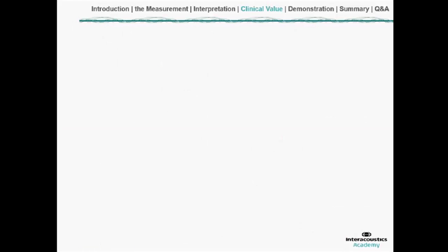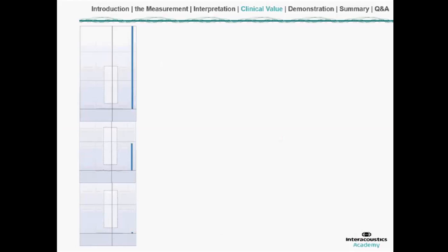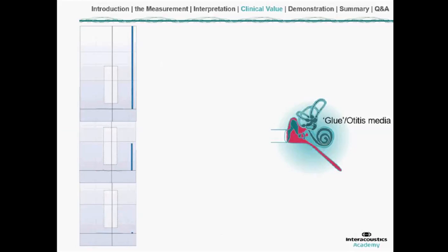Then we go over to the type B tympanograms. We start with the middle one. The middle one shows a flat line, and now we look at the bar. The bar is where the differences are, and for the middle one we see an ear canal volume which is roughly 1 milliliter. Could be my own ear actually.